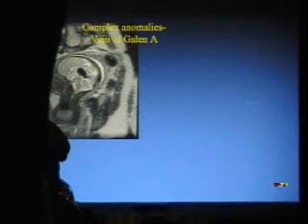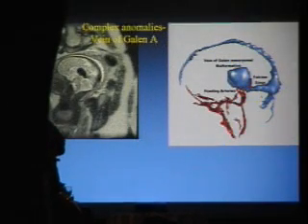Complicated things like vein of Galen aneurysms obviously can be diagnosed by ultrasound, but the role of MRI is perhaps in conjunction with the interventional neuroradiologists to help them plan the ultimate embolization or occlusion of these vessels. You can do cool things like this and take the data from MR, segment out all the vessels, and basically give them a roadmap before they do their angiogram.